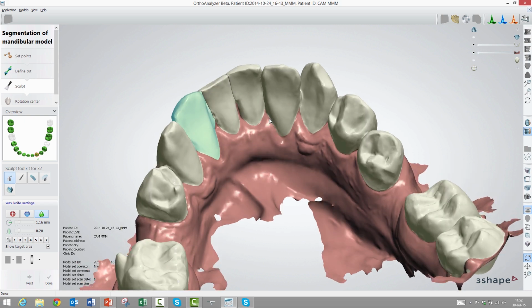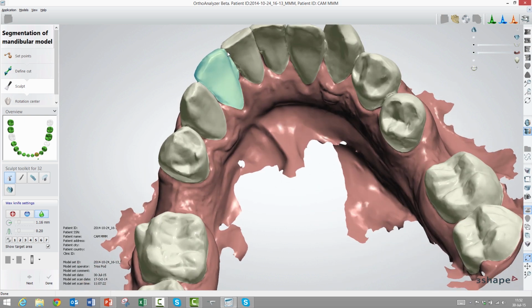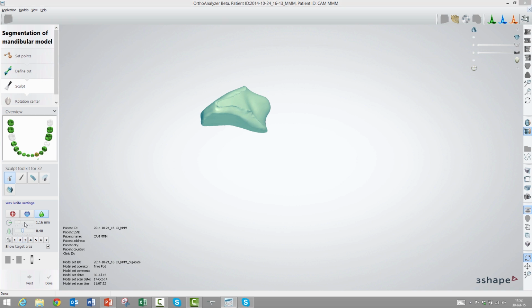Good. So now we're into the sculpting part, and in this part the lines between the teeth can be a bit rough, so I can go in and make some alterations to them. I can take away the chips. Oh yeah, there's some new sliders over there. Yes, exactly. And I can just turn it a bit, and depending how much and how big I would like it, I can go in and smoothen the edges of the tooth.